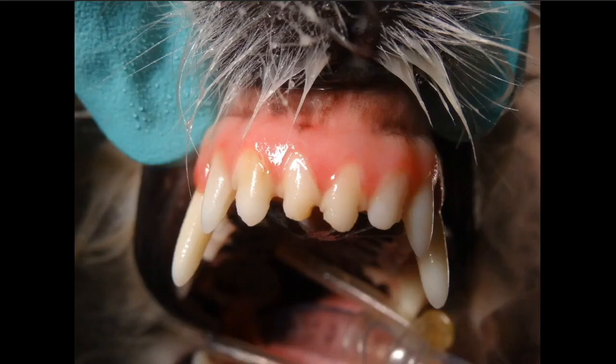So take a look at this image, see what you see. There are some changes there that you can note. They're not really obvious, but there are some changes there. So take a quick look at that. Make a note of what you see.